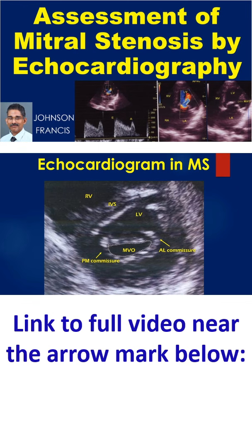The cut is slightly oblique as a good cut should appear circular. It is often difficult to get a good circular outline of the mitral valve due to varying anatomical features of the chambers and cardiac position. Ideally, the smallest full circle should be taken to planimeter.